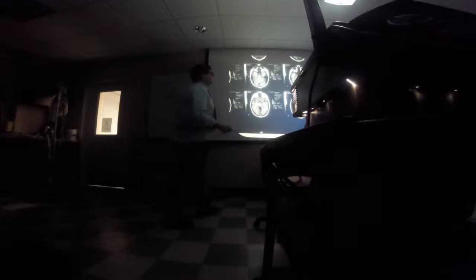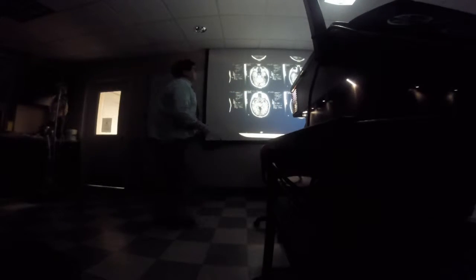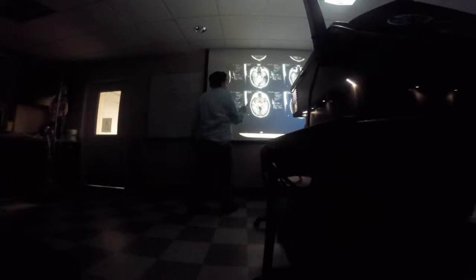This is running through the notch in the tentorium. Remember the tentorium cerebelli? Midbrain runs through it. Deep to the tentorium here is the beginning of the cerebellum. So this has to be a shot that's lower than this.